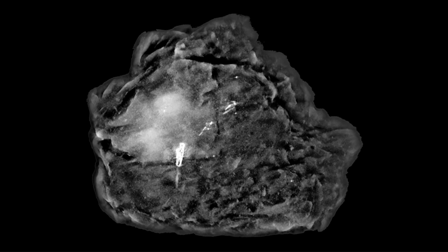About 20% of invasive carcinomas, 20%, this is not 2%, 20% of invasive carcinomas present at mammography only as calcifications. So invasive carcinoma, calcifications. Well, there's probably DCIS along with the invasive carcinoma. And at the core biopsy, if it's a dense breast, you may not see the invasive carcinoma.